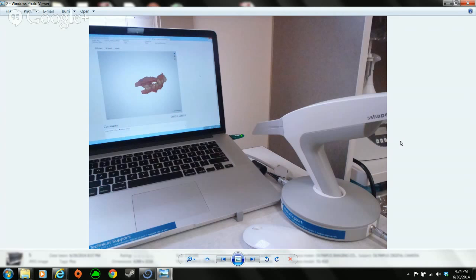I do more with a handpiece than I do in the computer because I don't want to take a chance on overdoing something in the computer and then I have to start over again. So yeah, you don't have to remove the undercuts. You can do it by hand. Also, with the fit of the guides, some people will have little gaps between their teeth. A 3D printer is going to print those interproximal areas, so you may have to take a burr and go in and knock these little edges out.